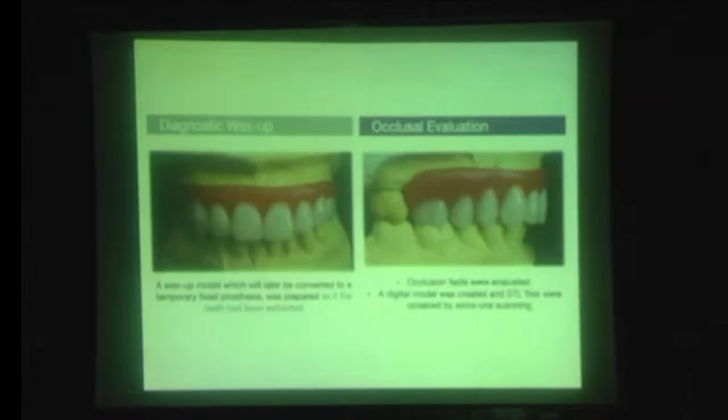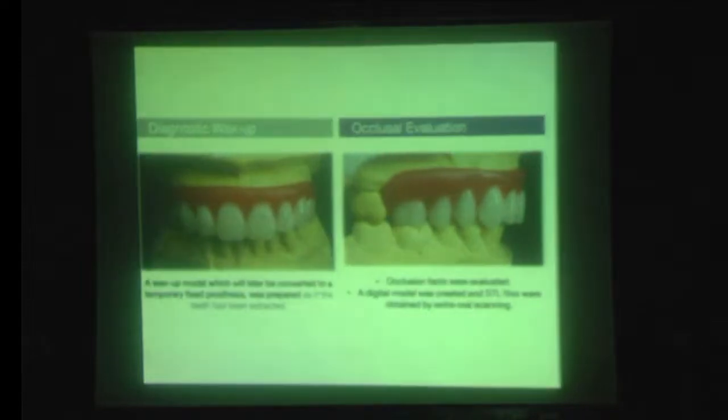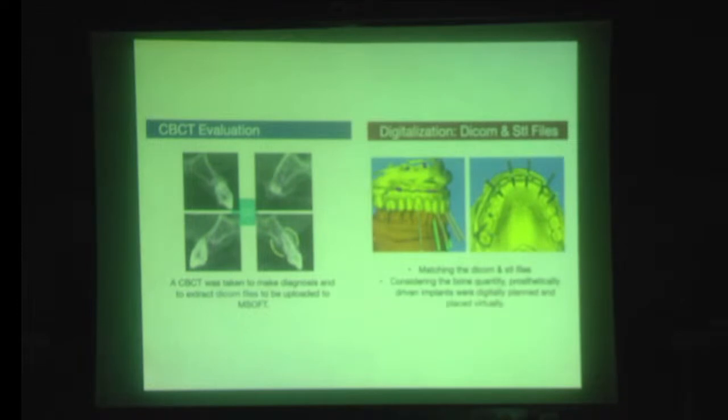You have to remove the teeth very gently. And occlusal evaluation, the facts were evaluated. Digital model was created and STL files were obtained by extraoral scanning. And our CBCT evaluation, CBCT was taken to make diagnosis and to extract the DICOM files to be uploaded to MSoft. And digitalization, this is what we call the matchmaking. You know, there was a book, Matchmaker.